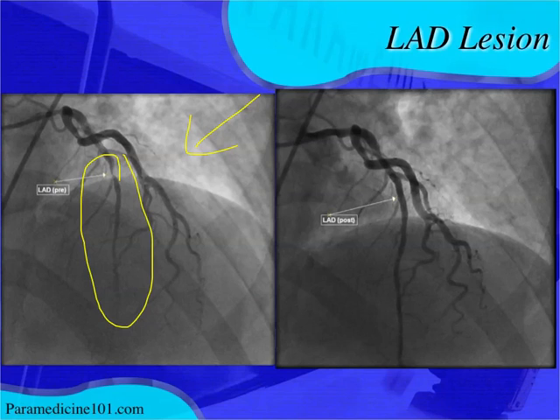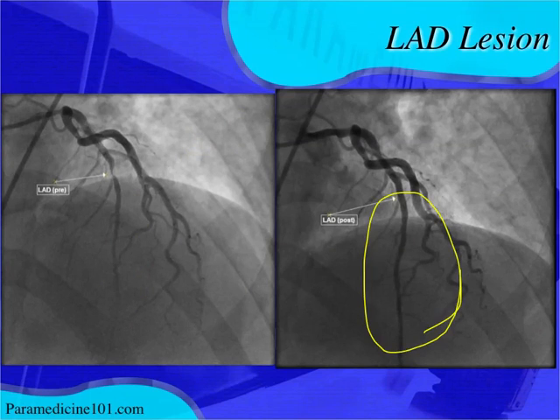Okay, and you do have some blood flow right here still to that coronary artery, but that might be because the patient's currently on nitrates. That could have been completely occluded with that first 12-lead EKG. And then after treatment, you'll see that stenosis is now gone, and the patient has returned blood flow to that very large LAD.